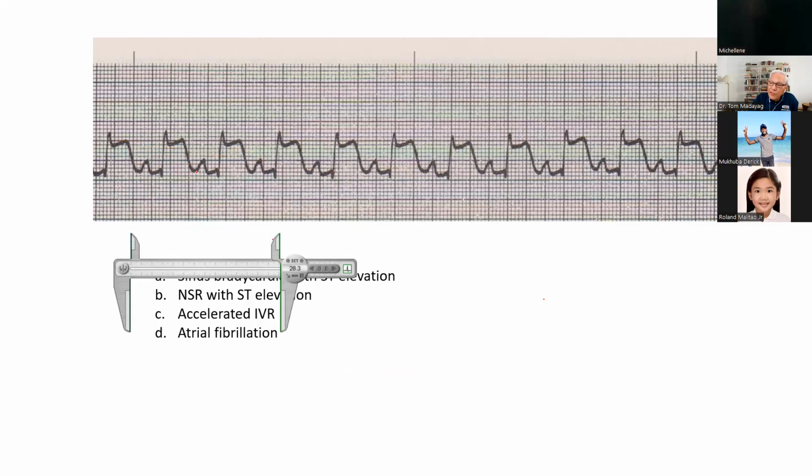So anyway, whenever you have an ECG, one of the things that you're going to try to look at is the ST segment. The ST segment is that segment or that part of the ECG that connects the S wave to the T wave. So in this particular instance, this is the ST segment where I'm pointing at right there. But the ST segment normally should be on the same plane as the PR segment, right over here. And as you could see, the ST is above the baseline. And so therefore, we're concerned about this.